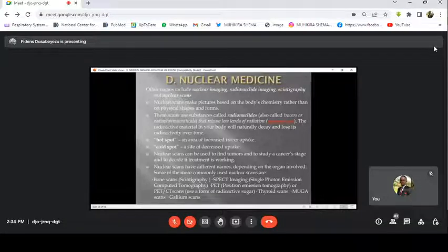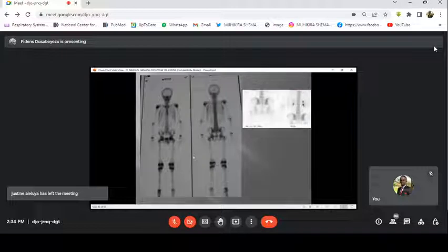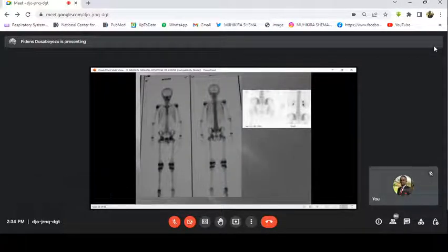Example of nuclear imaging. These images are from a bone scan, and from there you can see where there is either a hot spot or a cold spot, and say, this is symmetrical, this is normal. There is a reason why there is a hot spot. Increased uptake, symmetrical is okay. But when you check everywhere, you can see that here there is something wrong.